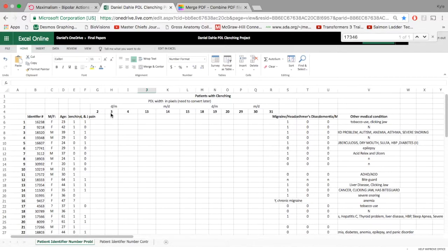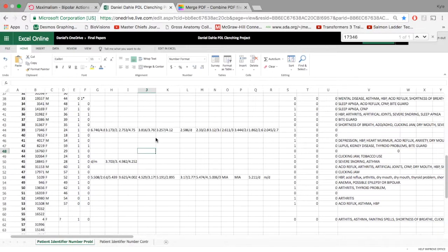We're going to be measuring basically the same way we do a perio chart. If you've ever taken measurements or perio charted a patient, we're going to be starting on the distal surface of number 2, going to the mesial surface, and the distal of 3, mesial, distal, mesial. Once we cross over midline, then mesial will be our first measurement, distal the next, mesial, distal, then we'll drop down to the bottom, and here once again we switch to distal, mesial, and so on and so forth. If you're not familiar with this, just follow along with the spreadsheet. It'll be pretty self-explanatory and pretty helpful once we get to an X-ray.